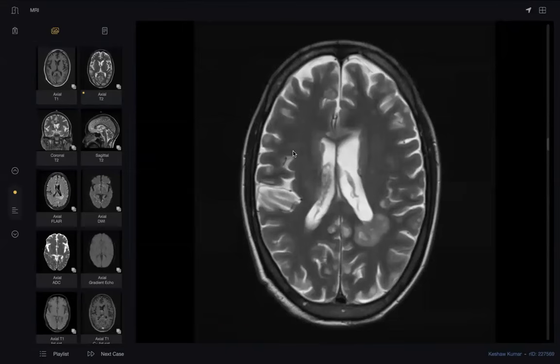Anyway, emboli have a specific pattern. It could be, but this long history. What else?